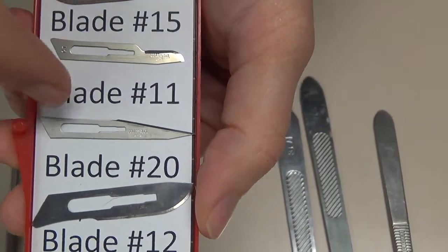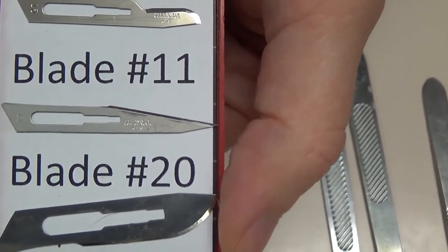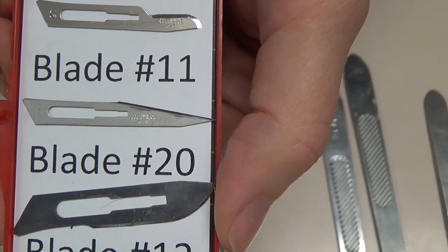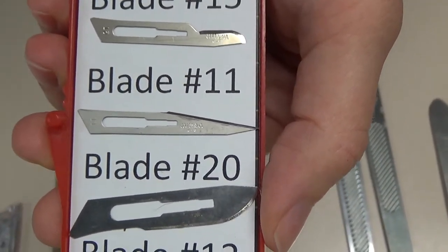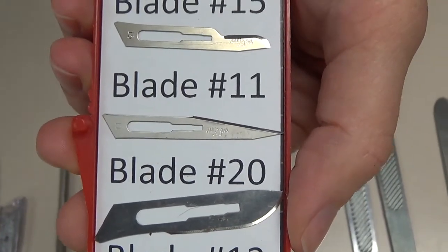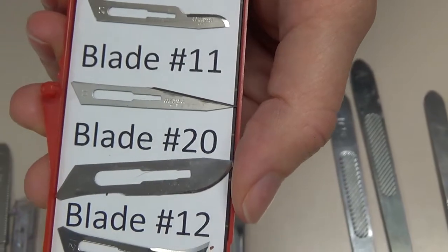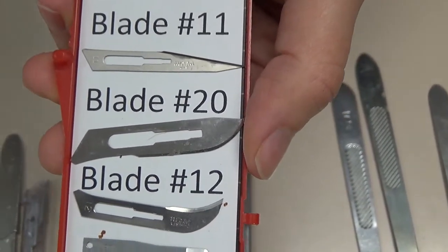The 11 blade, you can see, is very sharp and pointed at the end, so it makes what we call a stab wound, which is usually created prior to placement of what we call a trocar, which is an item that we put into a body area in order to pass instrumentations through when we do a scope type of a procedure. We can also use it to puncture a cyst of some kind, and again create that stab incision, where instead of it being a long incision, it's more of a down incision, down dissecting through the layers instead of cutting across the skin layer.